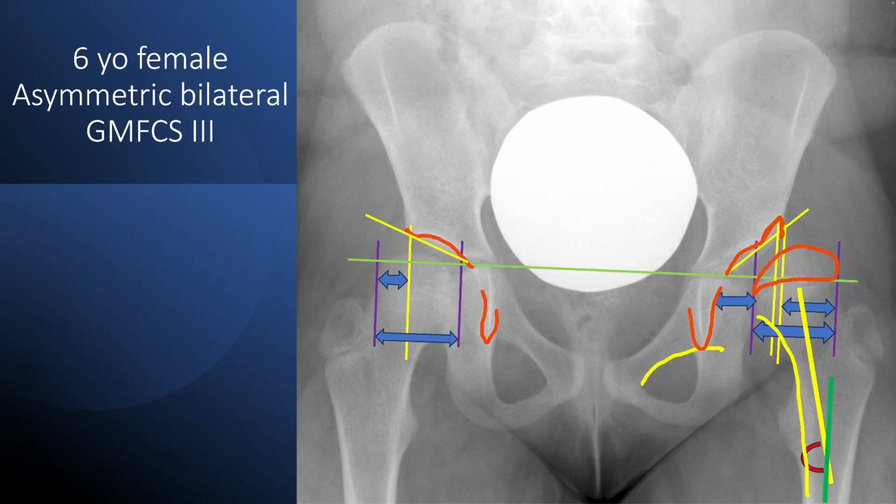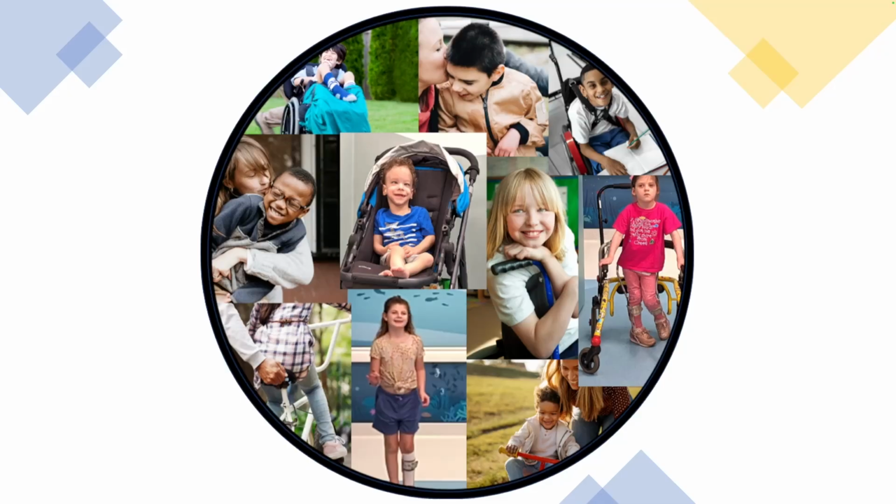All of these factors, considering both the acetabular and femoral sides, considering both hips, and additional clinical factors, will contribute to the surgeon's decision regarding what surgery a patient will likely benefit from the most. But no such treatment can happen without timely recognition and referral to them. Working together, we can help ensure children with cerebral palsy are able to function comfortably at their maximum potential.